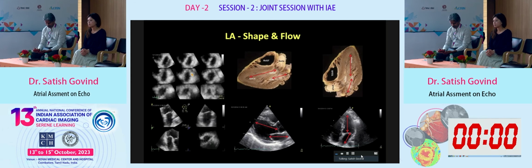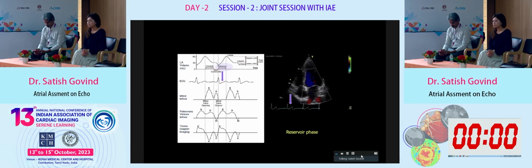Now, when you look at the left atrium itself, it has a very unique shape. Typically it has been described as a pillow shape, and it has a very unique way of dilating in different directions.